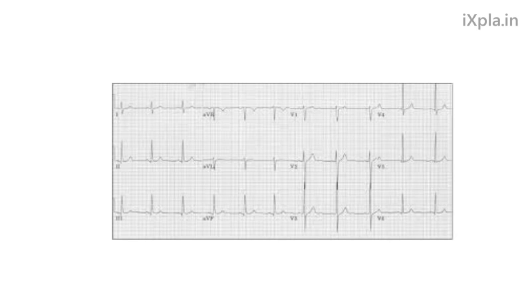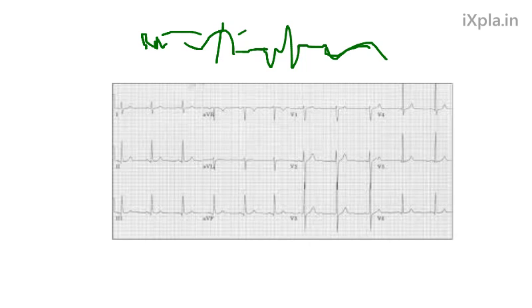Now, when looking at electrical stimulation, actually I'll put this in another video since this video is already 10 minutes. But that's the basic: the P wave, pause, QRS, and then the T wave going up. It's very important to note that you have the right atrium and the left atrium, so different ones contract at different times. And then this is the Q wave, the first downward deflection before the R wave, S wave, T wave.